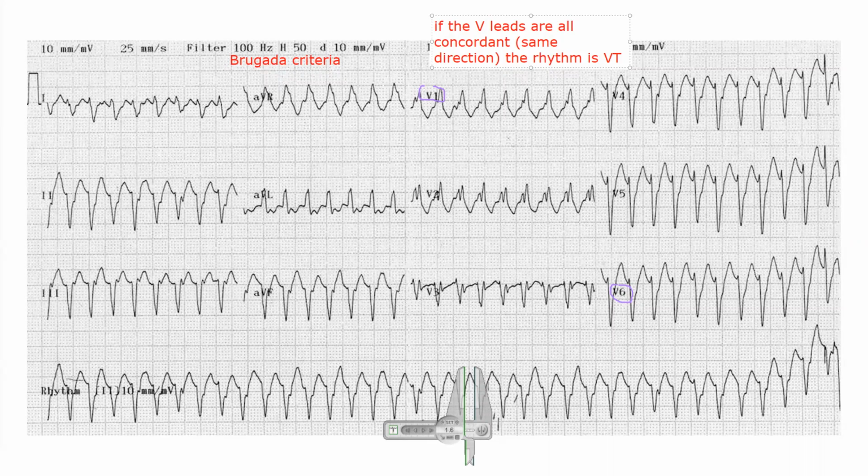We can't rely on the cardiac monitor to assume the differences between VTAC and SVT. Correct. Prim, whenever you have a patient in tachycardia like this, it's always our routine here in the United States that we obtain a 12-lead ECG. This is so that we recognize that there's going to be instances wherein we have a tachycardia that might be wide, and there are two possibilities: ventricular tachycardia, and the other one is SVT with aberration.